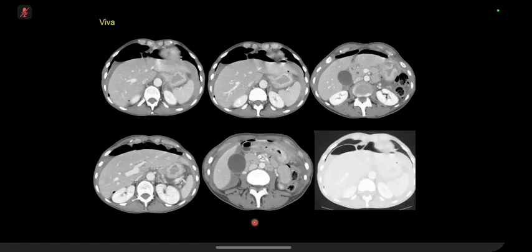There seems to be gastric wall thickening with increased attenuation consistent with enhancement in the region of the mucosal side of the surface, surrounding some fluid that's within the stomach. For example, in the upper right image.